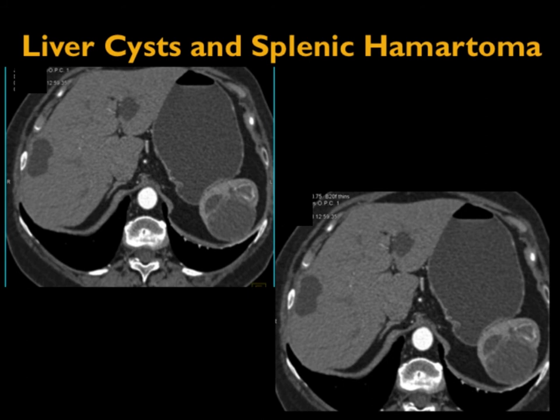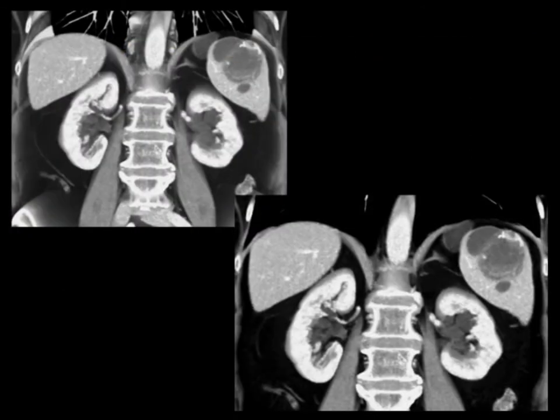Now, other lesions in the spleen can be tricky. Could this be an old hematoma? Absolutely yes. Could it be tumor? It really doesn't look like tumor. This was an old hamartoma. Very difficult case, and sometimes the spleen seems to merge to look almost like everything and anything, so it can be a challenge. What do you do if you're not certain in this case?